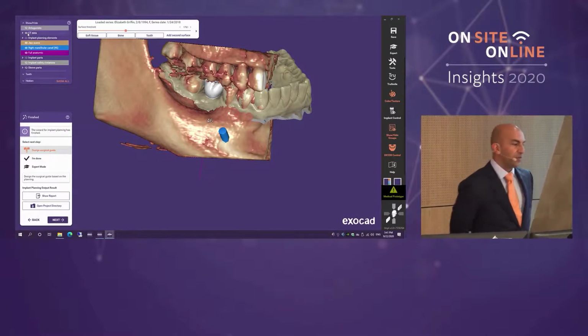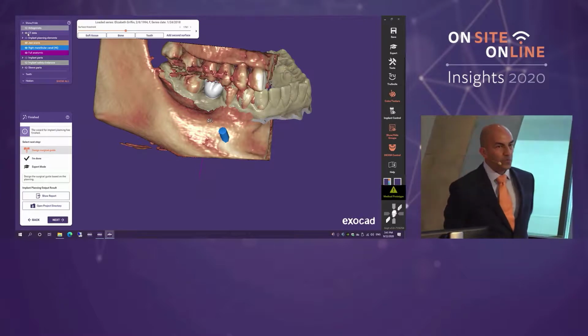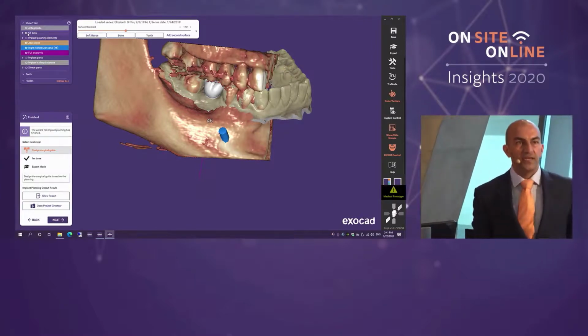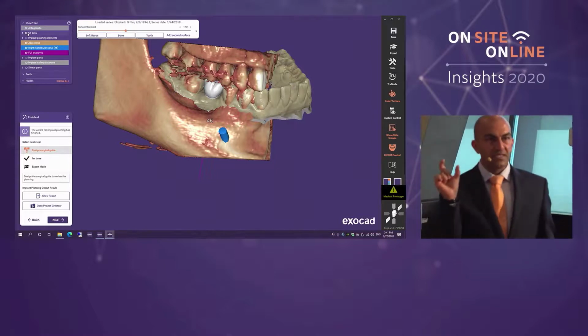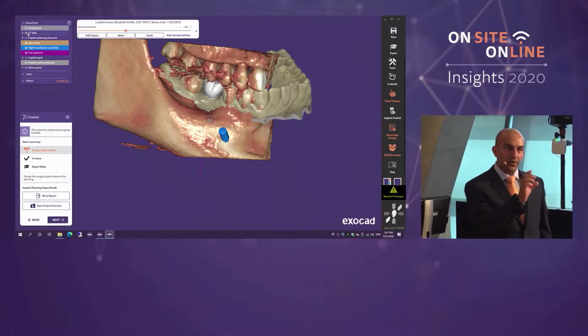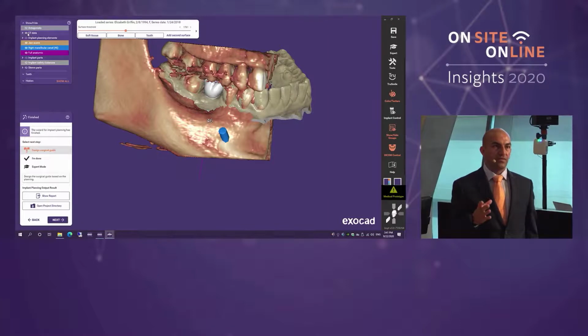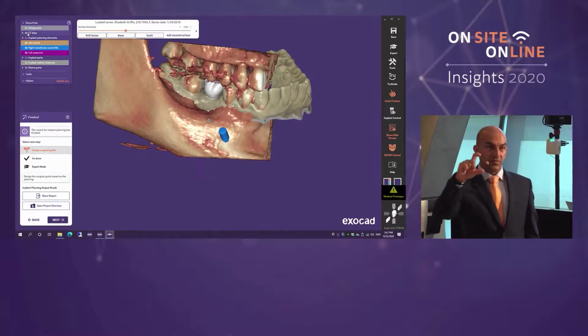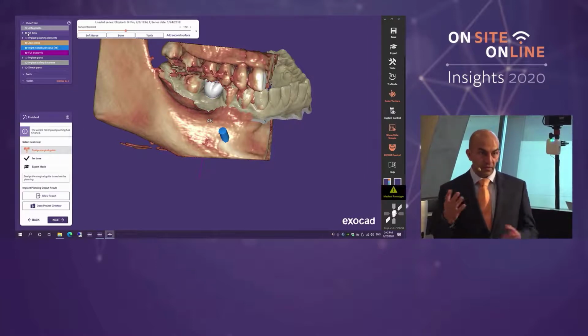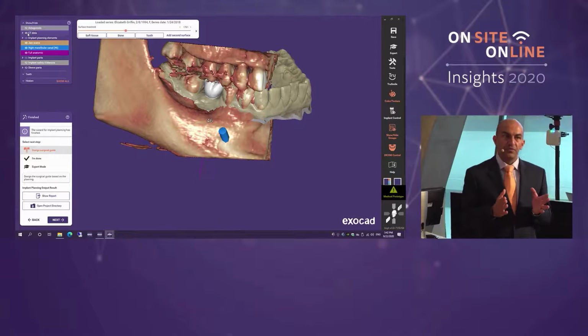Okay. You have a 3-point matching, and yeah. So when you do the correlation of data sets, it gave us a color scheme there, and the color scheme represents the deviation of data. The more blue there is, the less deviation there is. So when the software said, is this acceptable? Is this not acceptable, but I will continue anyway? Or should I discard the alignment and go ahead again? It gives you the option of doing that.